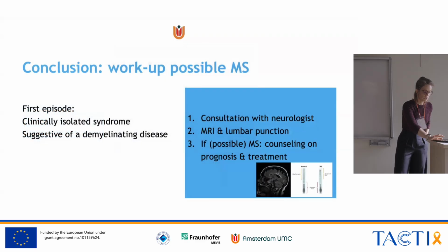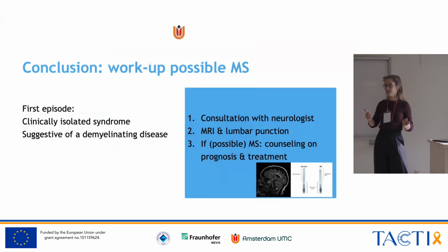So you can see how difficult it can be and how subtle the MRI problems can be. You sometimes really have to look for the tiny lesions in certain areas. But eventually you can make a diagnosis, and that again is important for the treatment.